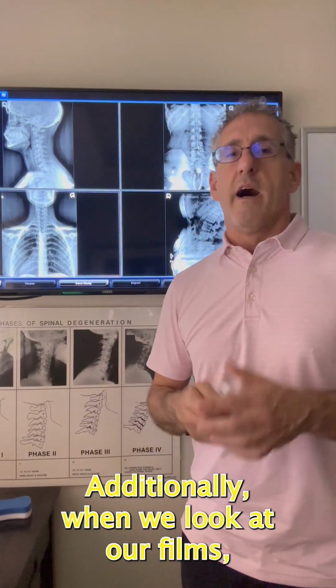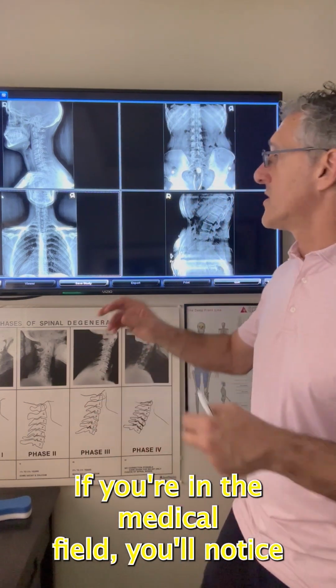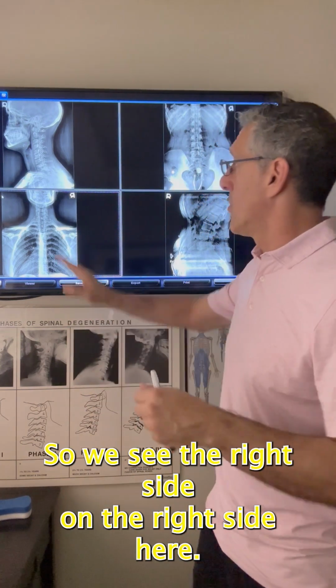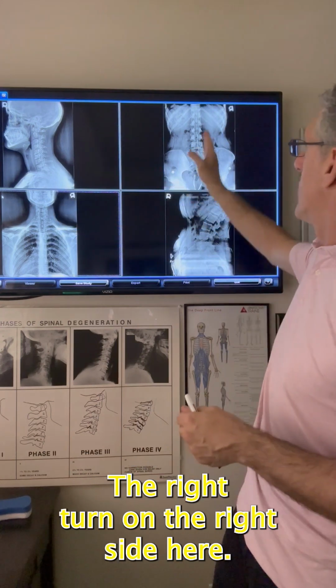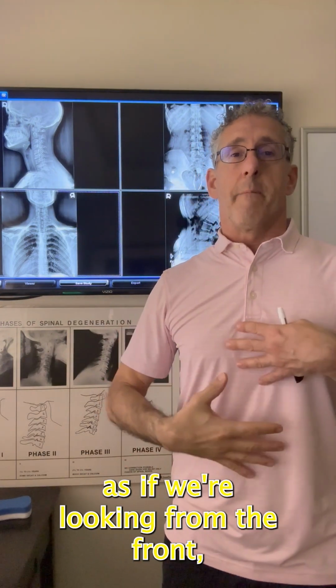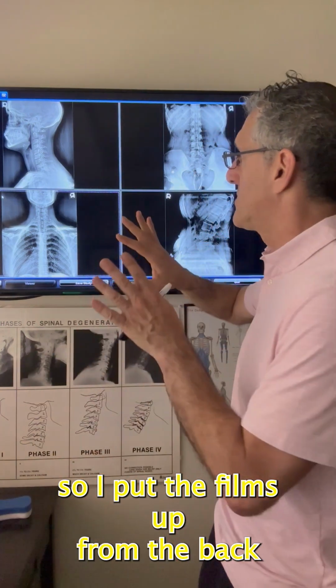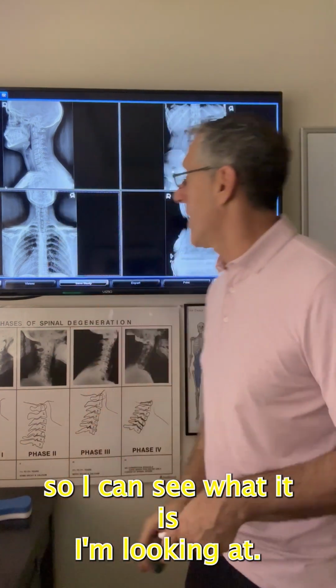We can see this evidence on our films, which is why we take films in the office before we treat many times. Additionally, when we look at our films, if you're in the medical field, you'll notice these films are backward, right? So we see the right side on the right side here, the right side on the right side here. Typically in medicine, we look at films as if we're looking from the front, but I work from the back. So I put the films up from the back so I can see what it is that I'm looking at.